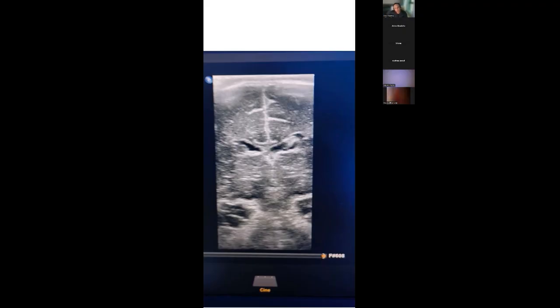The other thing I would recommend, if you've got techs coming in, is they can set up a cranial ultrasound preset, which basically means that it defaults to a depth of about 6 to 7 with a frequency of about 8. Then you'd get a bigger footprint, which gives you a much wider margin. So instead of having just this margin, you'd get something much wider like this. So have a play with it.